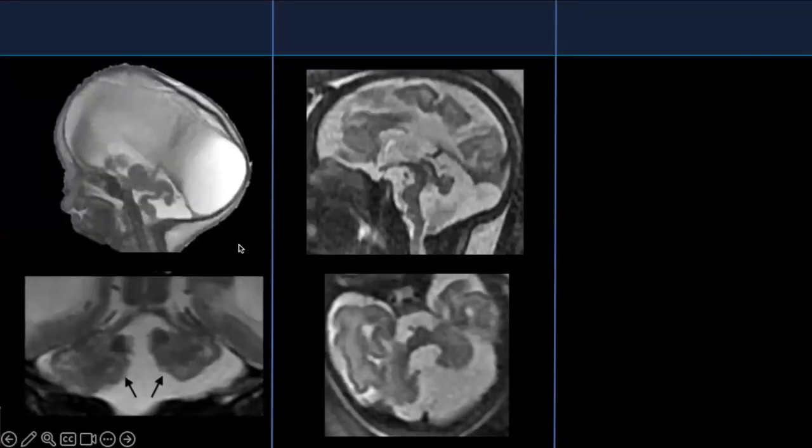Finally, diffuse malformations. So this is kind of a common problem that comes up in fetal MRI. What do you do when you have widespread brain underdevelopment, malformations, and a Z-shaped brainstem? Well, there are two primary differential considerations, and that is dystroglycanopathy and tubulopathy. So we can look for other things to help sort that out.